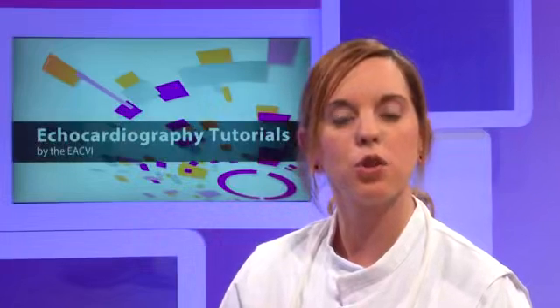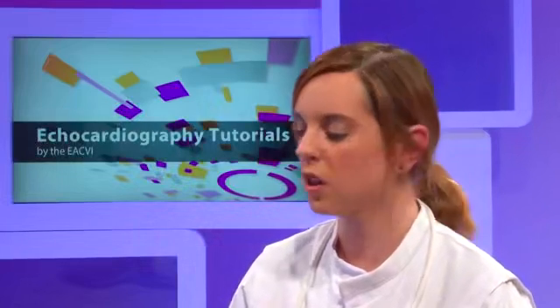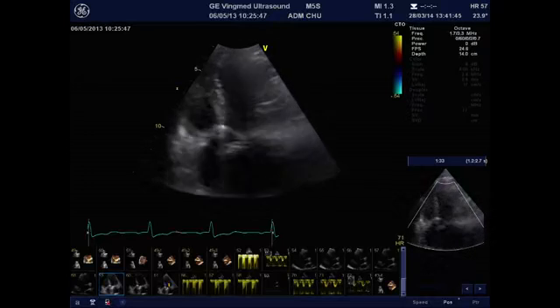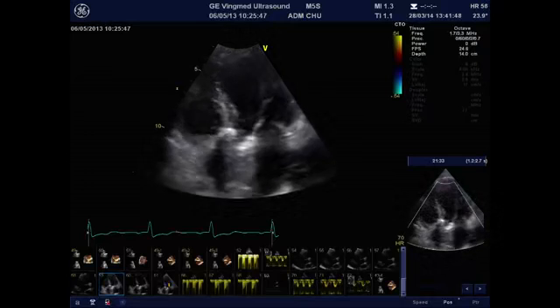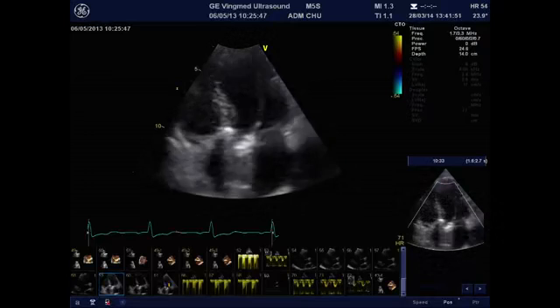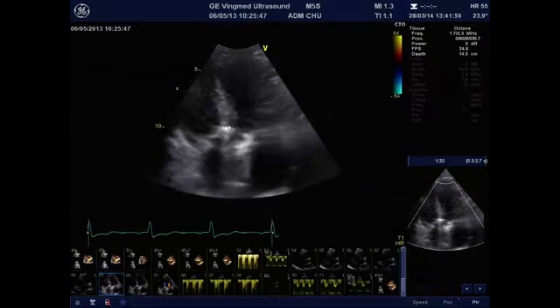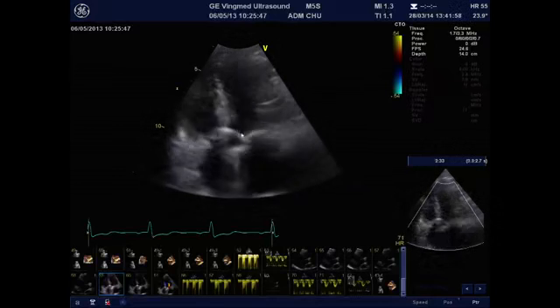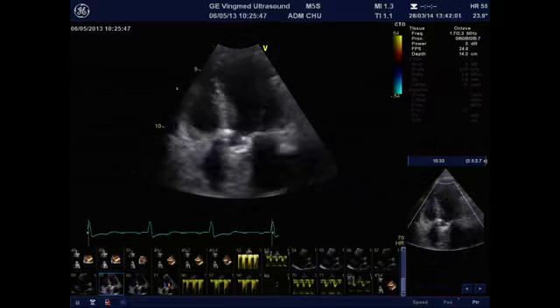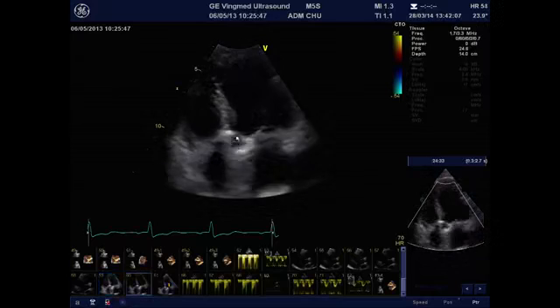Now I'm going to show you 3 cases of pathological evaluation. So the first case, it's a mechanical valve in aortic position. This is a Carbomedics number 21. Here, just when you look at the movement of the leaflet, you can see that just above the prosthesis, there's some hyperechogenic material over here that is a little bit strange.